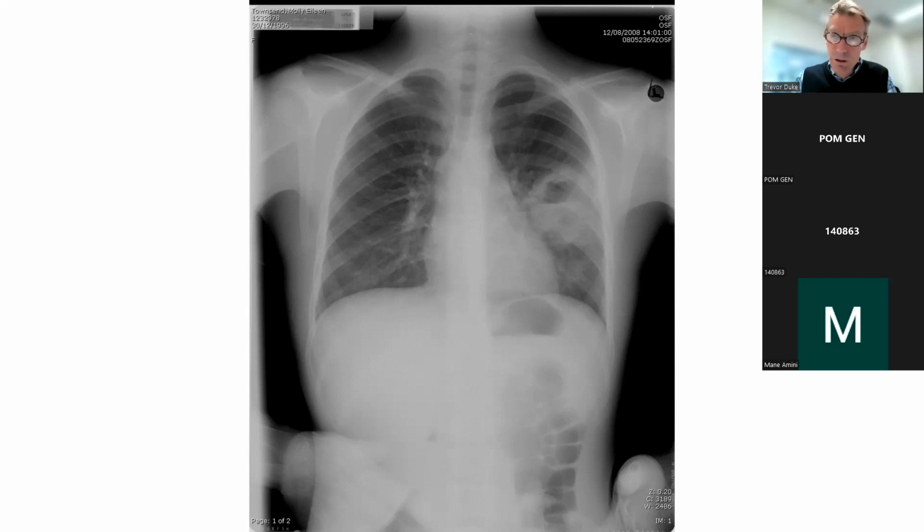If you've got an immunocompetent host, like this child was immunocompetent, there was no immunosuppression about this child, then having a Staph aureus lung abscess is the most likely thing. Good. So I just want you to be able to identify a lung abscess when you see it, and then think to the next step of, well, what could it be? And you should always think this could be Staph aureus.